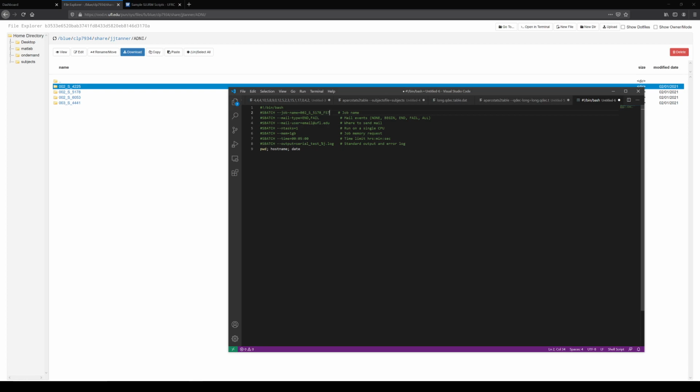That's okay, but it also misses part of the point of HiPerGator, which is that we can process in parallel. And so we're going to process it in parallel. And it'll be clear how that's going to work. So that's our first line.